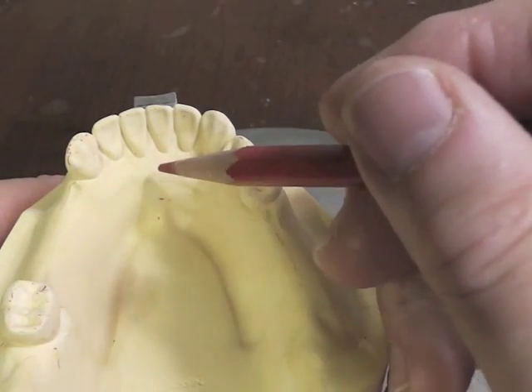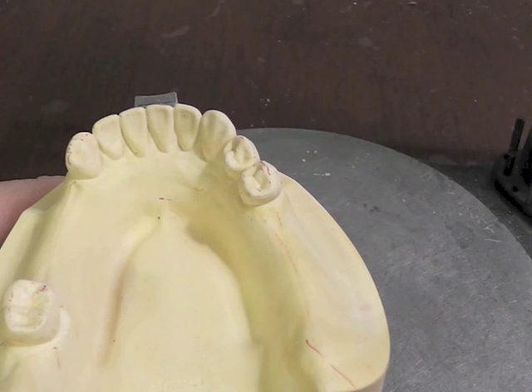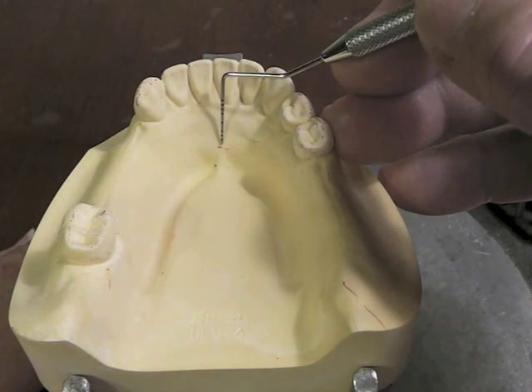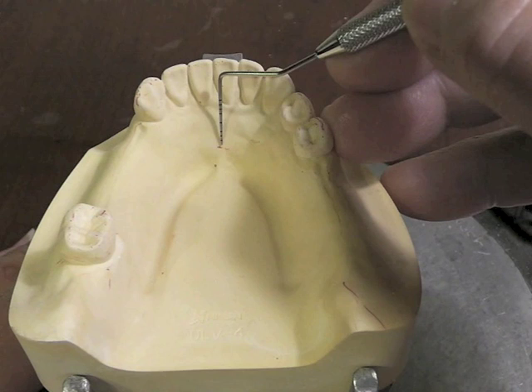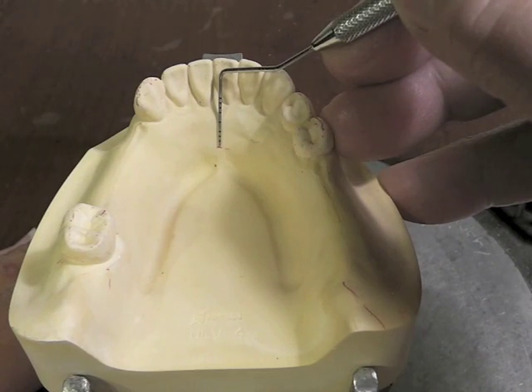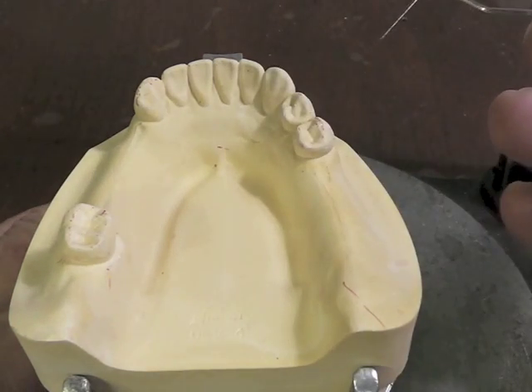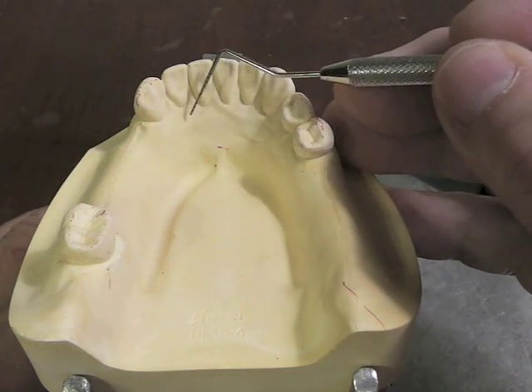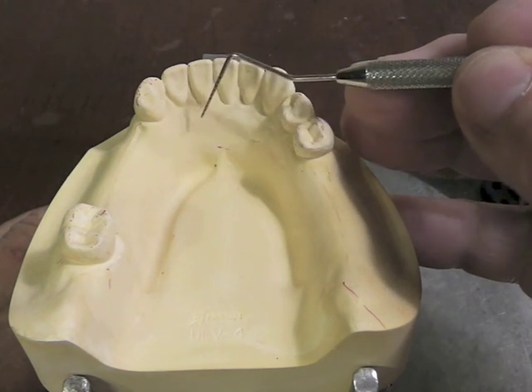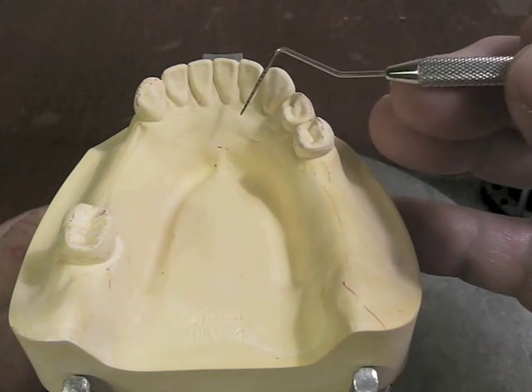That is a measurement you have to take in the mouth with a perioprobe, because our alginate impression material pushes all the tissues out of the way, and it makes it look like we can always use a lingual bar. When I go to the patient's mouth, I ask the patient to raise his tongue up in the roof of his mouth, and I try to measure the floor of the mouth from where the functional floor raises up to the marginal gingiva. And if I have a minimum of 8 millimeters, I can use a lingual bar, because I must avoid the marginal gingiva on the mandibular by a minimum of 3 millimeters, and my bar has to be a minimum of 5 millimeters wide.